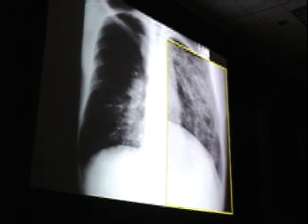The other thing to know about lymphangitic tumor is that it's almost always an adenocarcinoma. If you see that, you almost always know it's an adenocarcinoma, and I like to think that the four most common sources for that adenocarcinoma are actually shown to you on the chest film, and they are breast, lung, stomach, and pancreas. Right? So breast, lung, stomach, pancreas are the ones that will do it most commonly, but it will almost always be an adenocarcinoma.